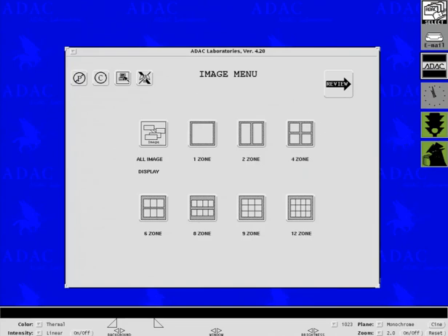This and this are telling me the exact same thing. This is telling me graphically, when you start getting up into the higher percentages, he will turn yellow. Eventually he will turn red. When he turns red, you're not going to want to be acquiring anymore. The system will become unstable and you can lose patients. So don't do that. You don't want to even get this into the yellow. The system's going to run a lot slower and just be finicky for you. So archive your patients off, get rid of them, keep track of them, whatnot.